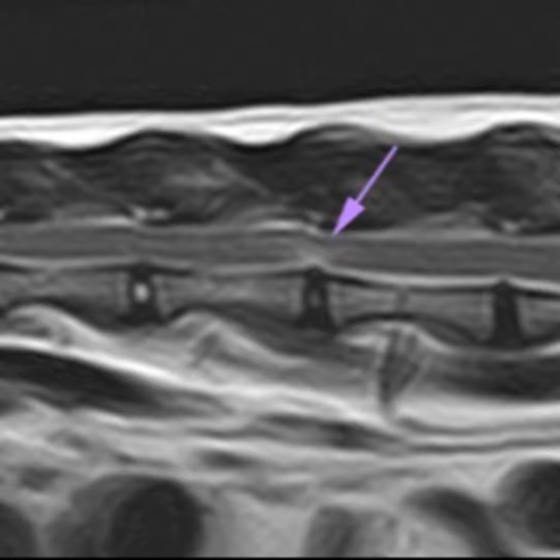At least feline intervertebral disc herniation have been reported mainly as single lesion, with only 7.5% of cats having more than one intervertebral disc involved. We found in our study the same distribution, with only 4 out of 43 cats affected by multiple lesions, so 9% of cats, and all were diagnosed with intervertebral disc protrusion. This finding is in accordance with these previous studies in dog, in which the presence of multiple compressive lesions was associated with a diagnosis of intervertebral disc protrusion.